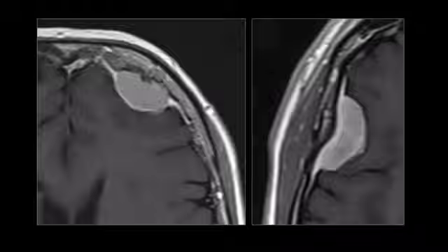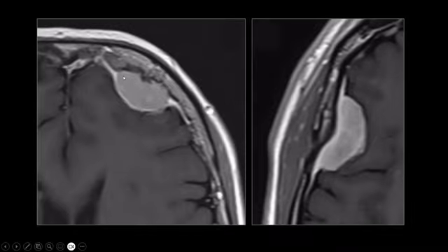Another sign often associated with extraaxial brain tumors, and more specifically meningioma, is the dural tail sign. What is a dural tail sign? It's enhancement of the dura immediately next to a brain tumor. And this enhancement typically has a somewhat different intensity of enhancement compared to the actual tumor, and tends to taper from medially to laterally, or from immediately close to the tumor to far away from the tumor.